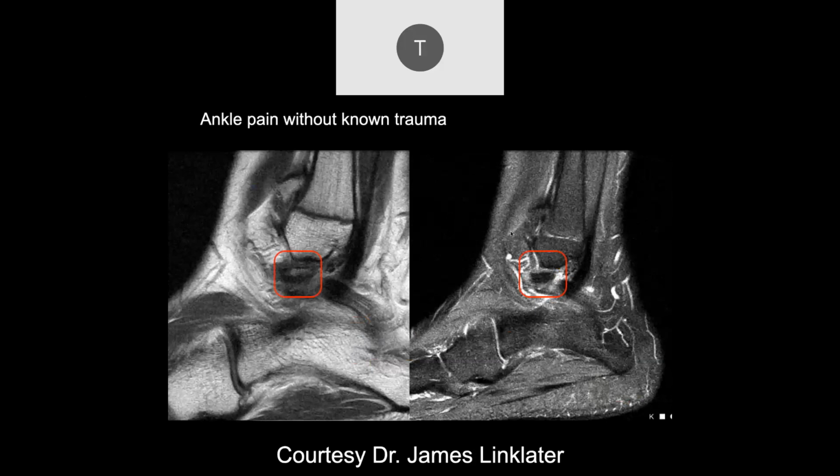If we're discussing whether or not it's post-traumatic, I guess an avulsion from that. Yeah, I think the majority of these, and it really looks like it could come right from this location, are old avulsion injuries at the attachment of the anterior talofibular ligament.